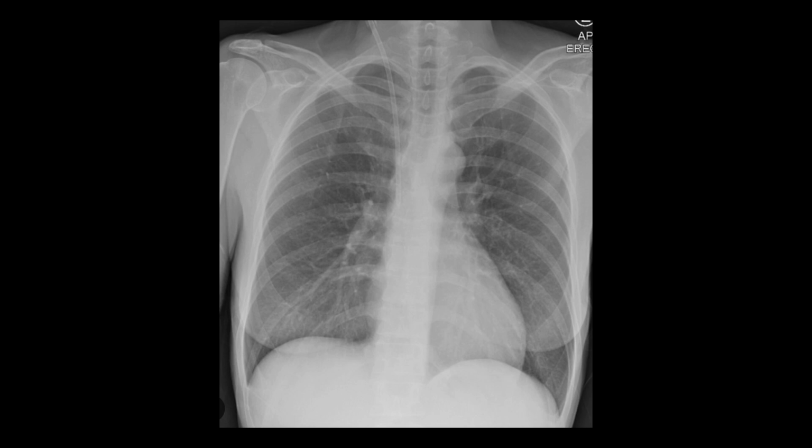Let's discuss central line confirmation with ultrasound. First, let's review chest X-ray confirmation of central venous catheter placement. This is still a viable approach. Here you'll note that the right IJ central line is located near the level of the right atrium and SVC junction, which is an ideal location.